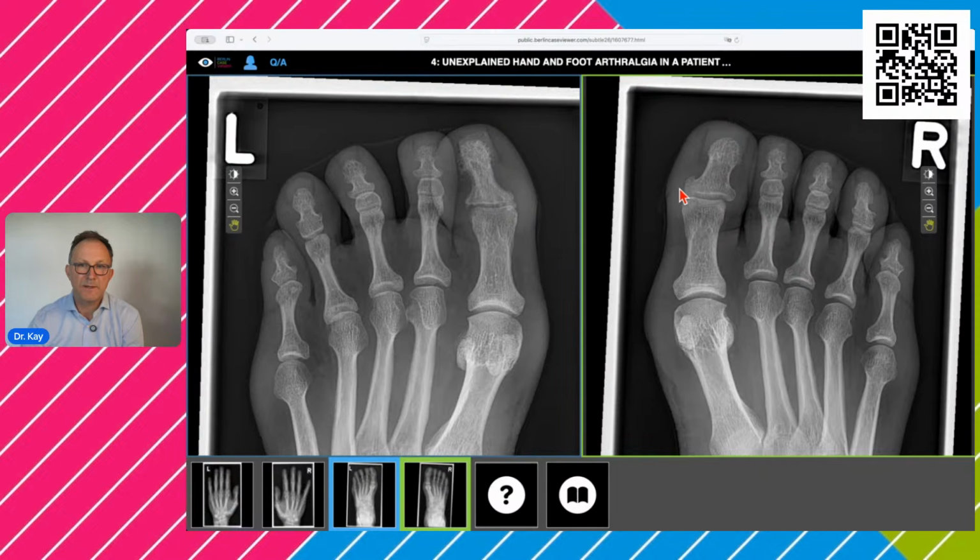Maybe it's here as well, but it looks a little bit more pronounced on this. This looks good, but here maybe. And then you see this irregular spikes at the distal end of the phalanx. Also, if you compare the pattern of the spongy bone, this looks normal. But here we have diffuse sclerosis, and there are irregular cystic areas over here.